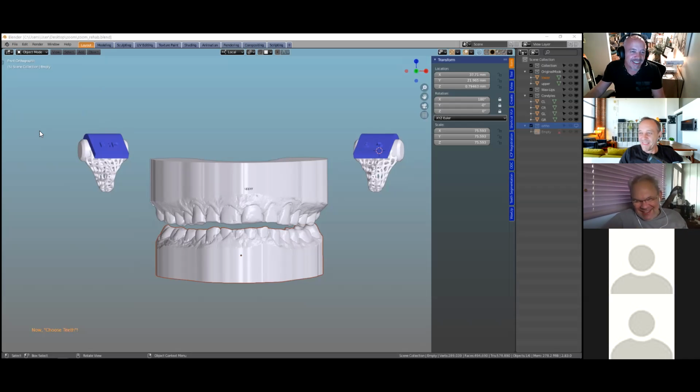That's quite good. Now I've got it. I've just got it unchecked. And the model design, it's all there. It's all here. It's just unchecked.